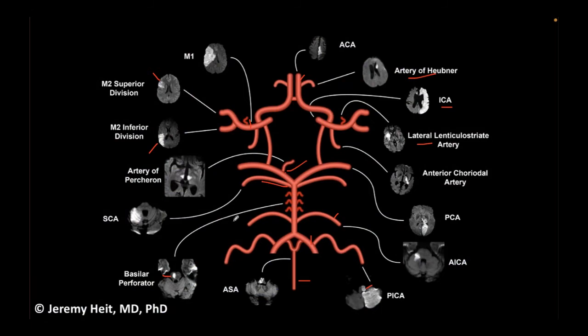So this one image is all you need to burn in your head. So when you see something quickly, you can come to, okay, this is what's happening. And then you target those in all your other images in your sagittal, coronal and make sure that you are right.